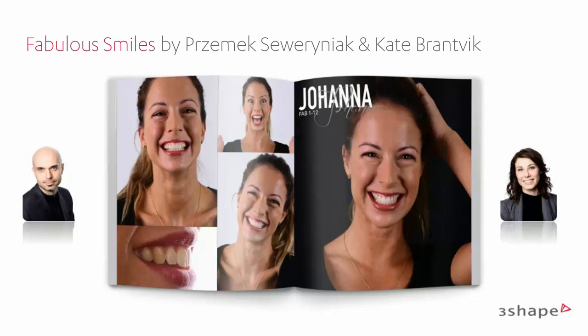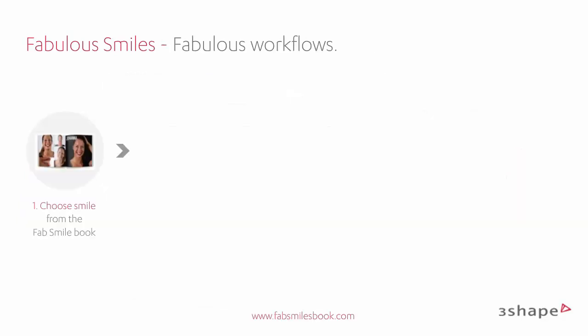So basically what they have done is they take pictures of a large number of patients, and it's a little bit like going to the hairdresser. You can choose what haircut you want looking at pictures. Now you have the Fabulous Smile book here, and you can choose the smiles from that book. So that's really cool. And what's even more cool is actually coming on the next page here, because basically the first step is that you look in the book and find the smile you like.